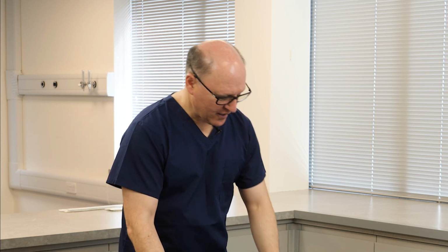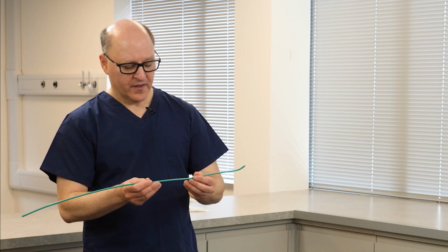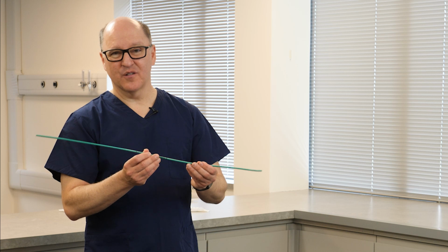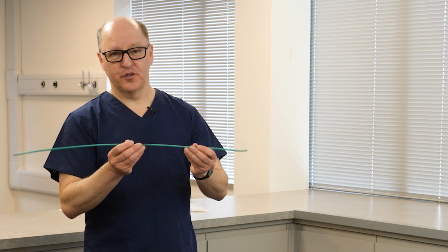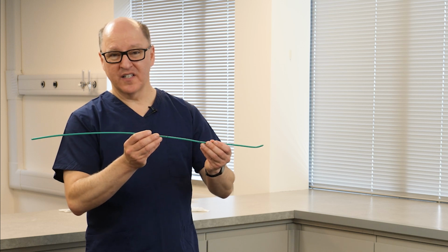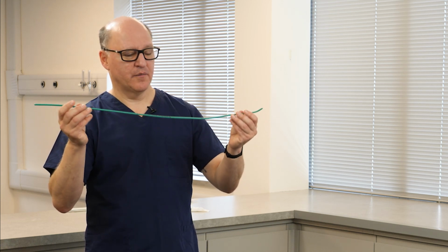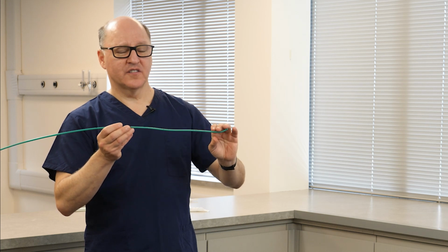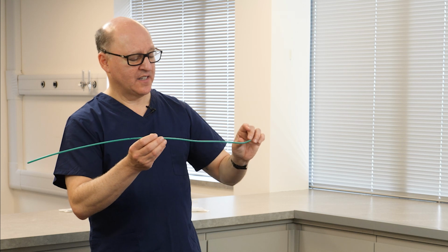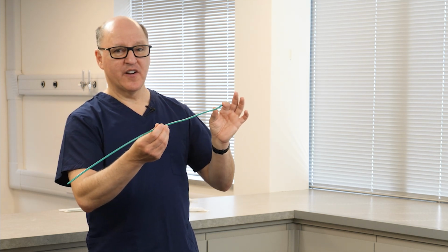And Robert McIntosh in 1949 was an early promoter of using what he called gum elastic catheter, what we now call the bougie. The bougie is a round rod, relatively long dimensioned, 65, 70 centimeters long. It has an upturned distal tip. And because of its long axis with a small distal deflection, its side-to-side dimension is very narrow.